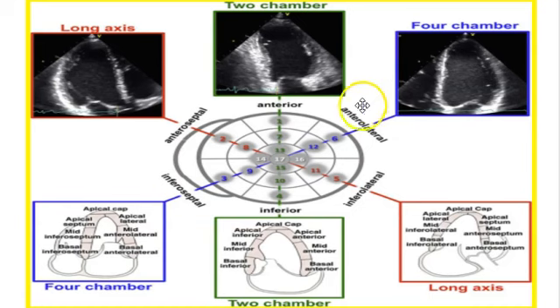Another way of looking at that is, this is out of the ASE, where if you take our different 4 chamber cuts of the heart from the apex, long axis, 2 and 4, and you see how these are colored red, green, blue here, and you see how this little arrow comes in like this right here. So this little line comes through here, the red, blue, and green cut down through this bullseye view of the heart, and you can kind of see how that corresponds to what we're looking at when we make that cut through the heart.